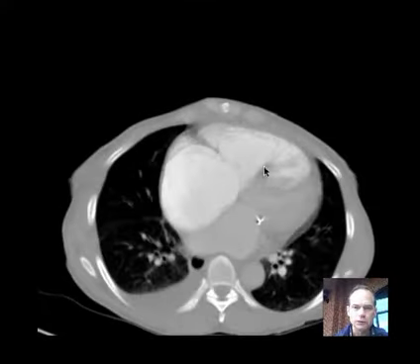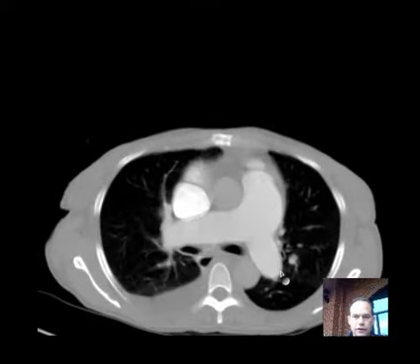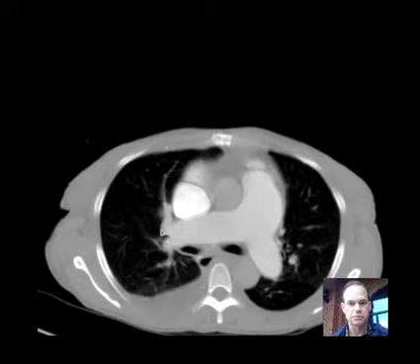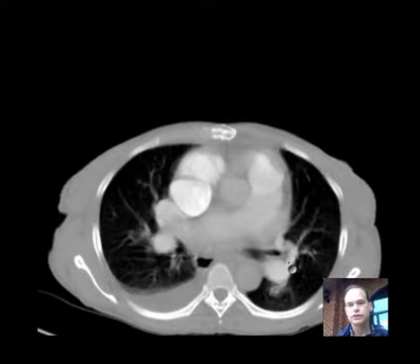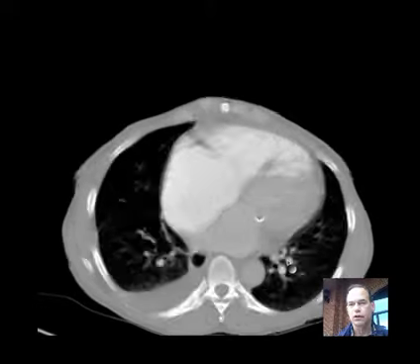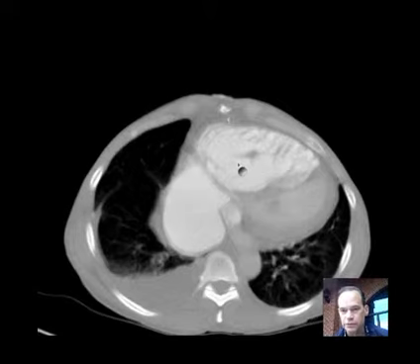So pulmonary emboli, which lodge in here, and in the distal branches, but especially they tend to get stuck here and there, in the distal right and left main pulmonary arteries here, cause so much resistance that the heart is unable to empty.